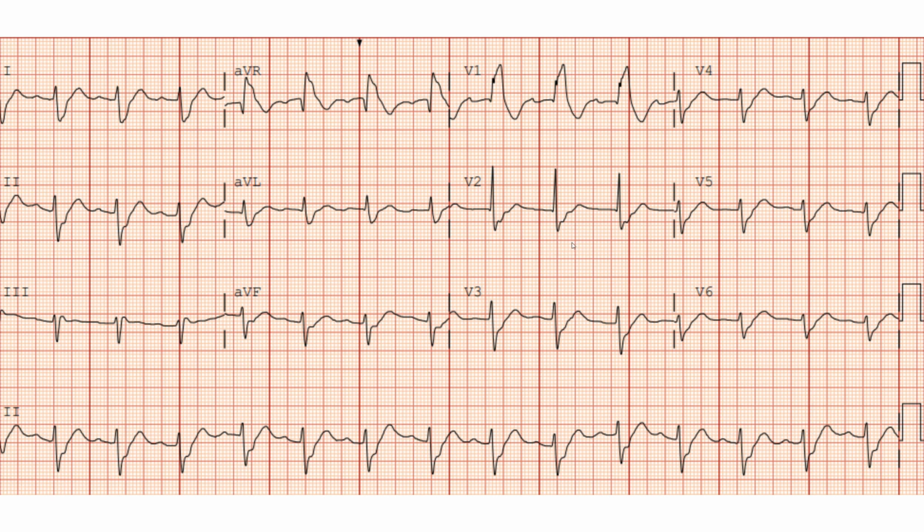And also, I hear a lot of you residents trying to use Sgarbossa's criteria when we talk about a right bundle. Okay, don't do that. Remember, Sgarbossa's criteria is only for a left bundle branch block or a ventricular paced rhythm.